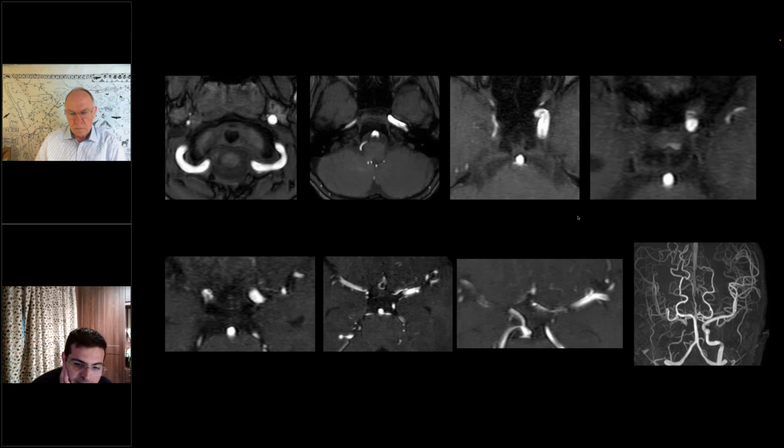The left side is pristine and probably will supply most of that contralateral head. I don't think the vascular change can completely be labeled as watershed only in this respect, because you have an obvious vasculopathy of a large vessel. It will still be useful to baseline the kidneys, making sure there's no impairment. I guess you've done the blood test, but have you not done renal and systemic Doppler studies? No. You might want to see if there is any systemic handle to this, which might help you with the diagnosis. Otherwise, it seems to be localized to a large segment of the internal carotid on the right side.